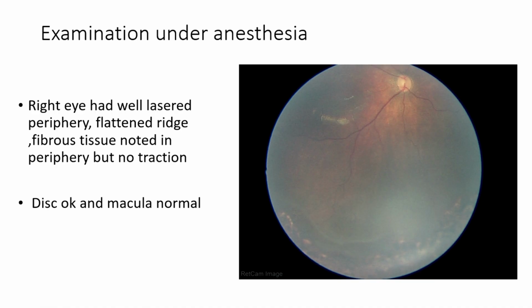But what is the main thing that you can see? There's no plus. Right? Ridge is white. So what does white mean? It's fibro. White means it's organized. The right word to use is organized. So white means it's organized, which means it doesn't have any blood vessels. It is organized now. It has reached the final phase of remodeling. Okay, go to the next.